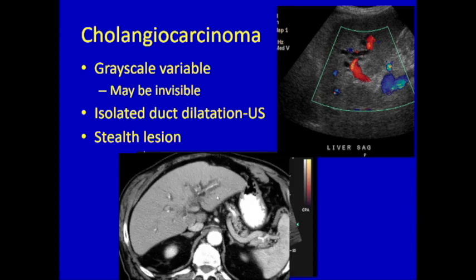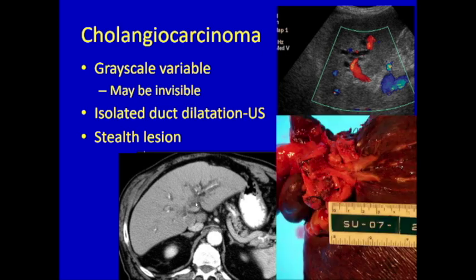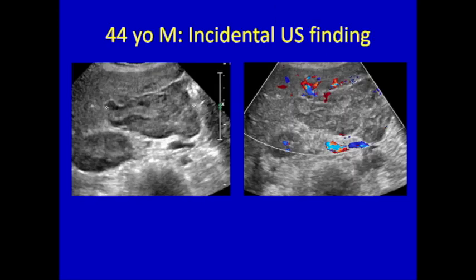Here you can see on CT dilated ducts, and here is a little bit of the mass centrally. And when you look at the path, again, a stricturing lesion, sort of crawling along, sometimes crawling in the ducts as well. I didn't bring you more ductal pictures, but just remember if there's a mid-duct lesion that's a soft tissue mass, that's almost always cholangio as well.